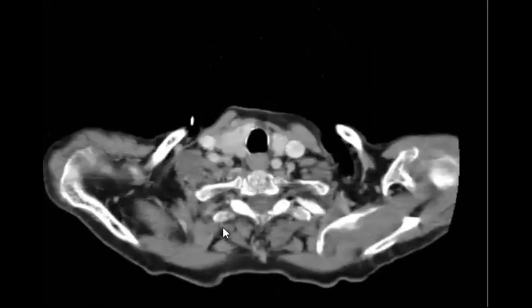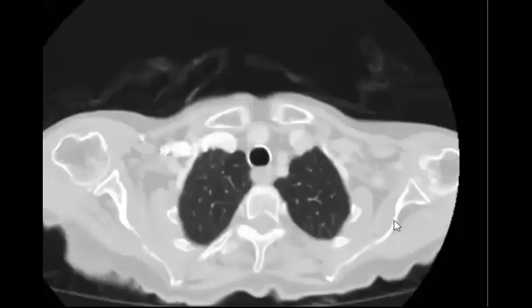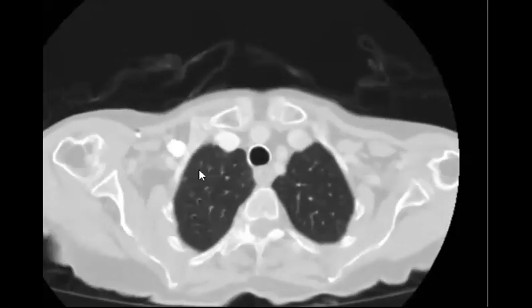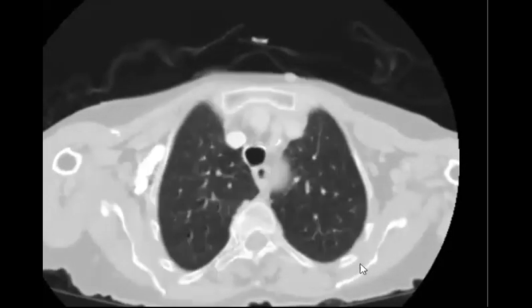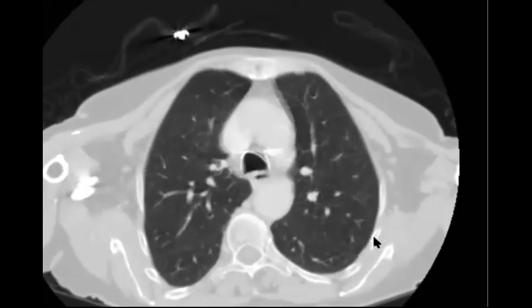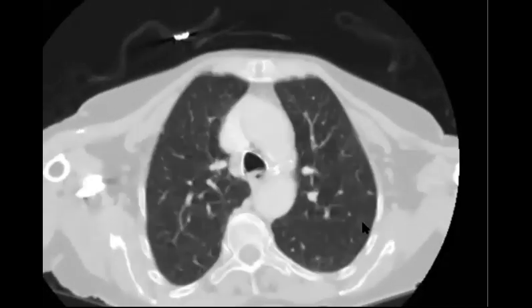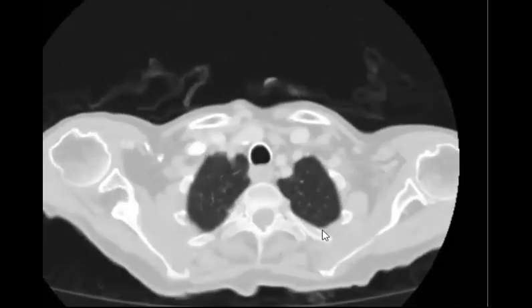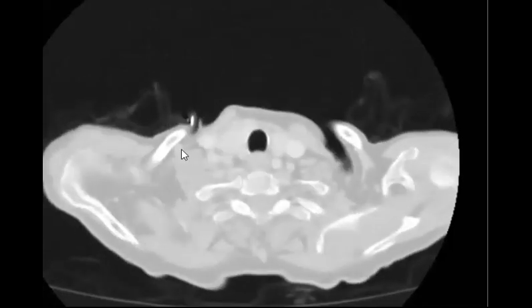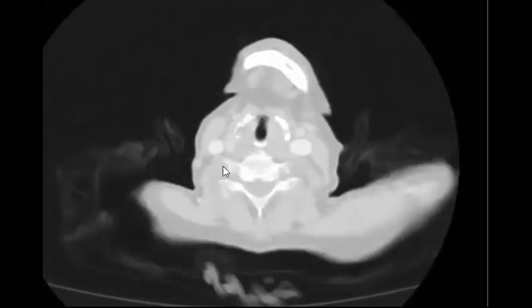And don't forget that this patient has some pulmonary nodules, which can be non-specific or indeterminate, but could also be metastases, right? So maybe it could be a metastasis. Do you agree with me that it is now going more with the suspicious criteria? And it's important to see that the supraclavicular region is a very dangerous space, so you should be careful.